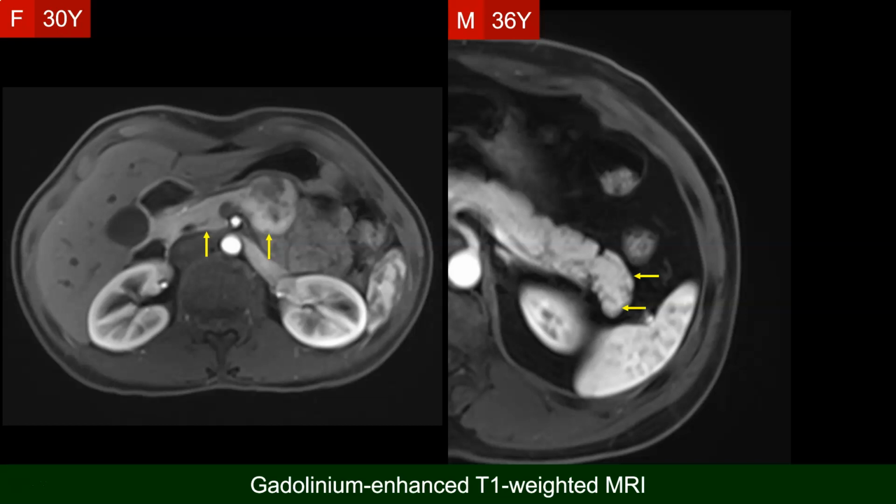First, the gadolinium contrast agent moves into the intravascular space of the lesion more than it moves in the tight interstitial space, and this movement is responsible for dephasing and a certain degree of signal loss. Second, gadolinium arrives in higher concentration into the intravascular space, and this is responsible for higher T2 effect, which reduces the signal intensity even on the T1-weighted images.